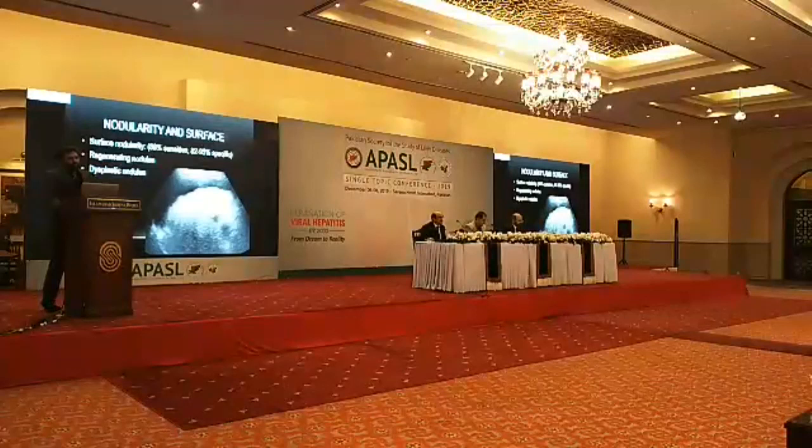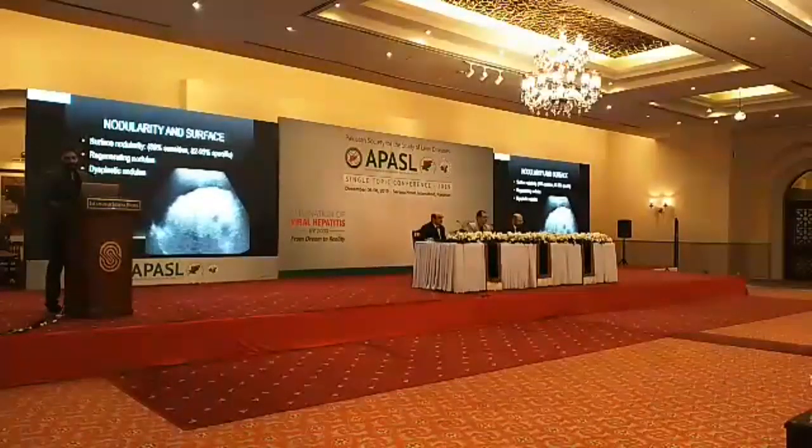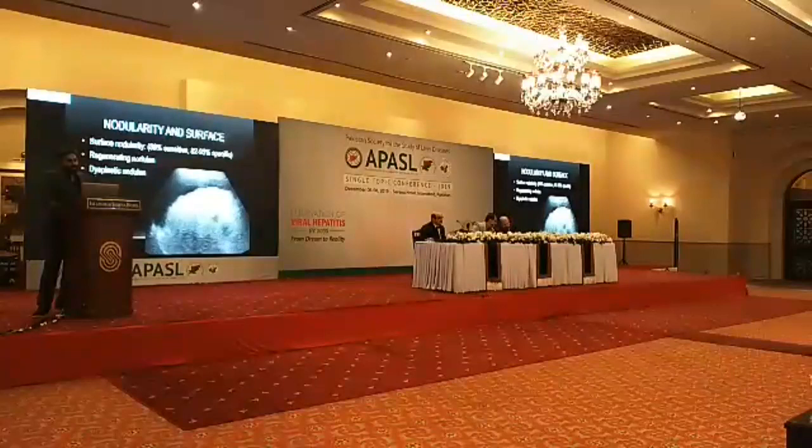It's easy to see it, as in this image, when the patient has ascites, but when the patient does not have ascites, it is not usually commented on well. And those are the patients whom you suspect of portal cirrhosis, and you want that information. So surface nodularity is very specific and very sensitive as well.